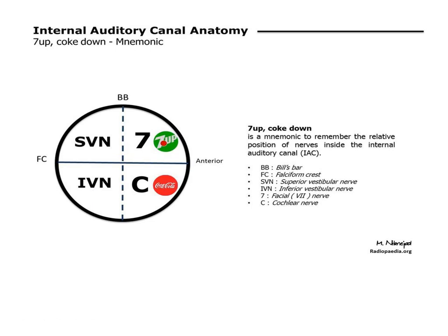This is of very high importance in people planning to undergo cochlear implant. For a cochlear implant, we need to see whether there is one nerve or four.